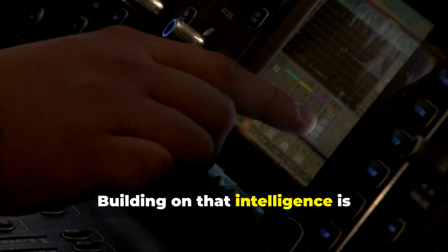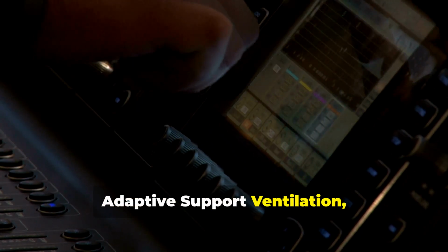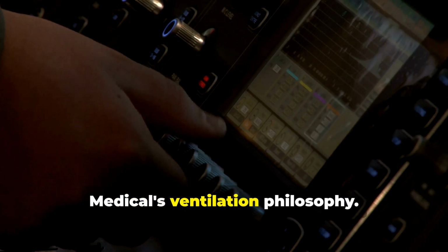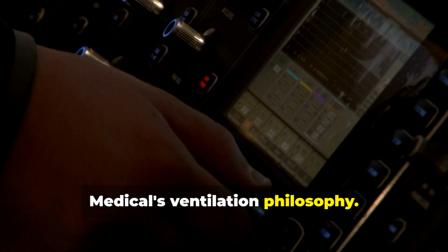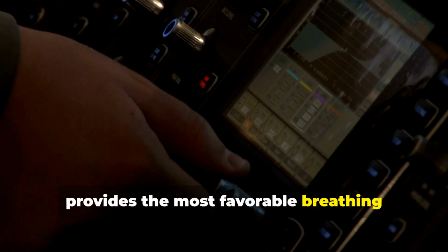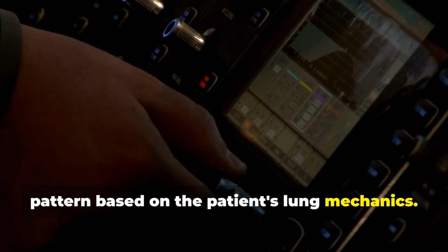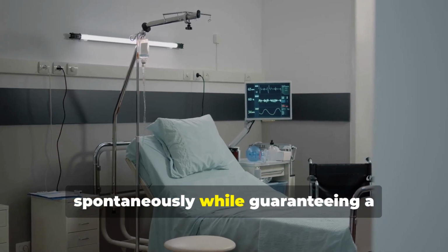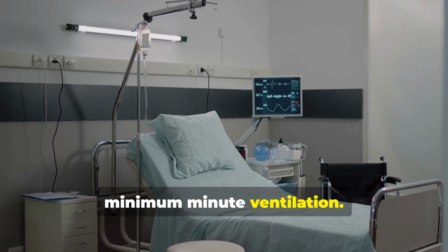Building on that intelligence is adaptive support ventilation, or ASV. This mode is the foundation of Hamilton Medical's ventilation philosophy. ASV automatically determines and provides the most favorable breathing pattern based on the patient's lung mechanics. It encourages the patient to breathe spontaneously while guaranteeing a minimum minute ventilation.